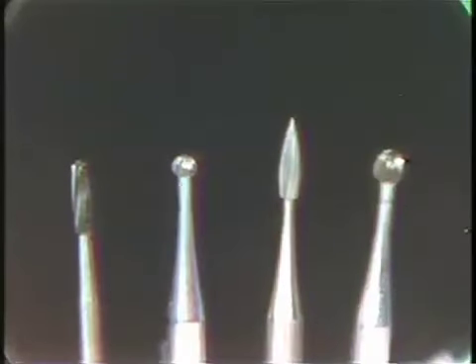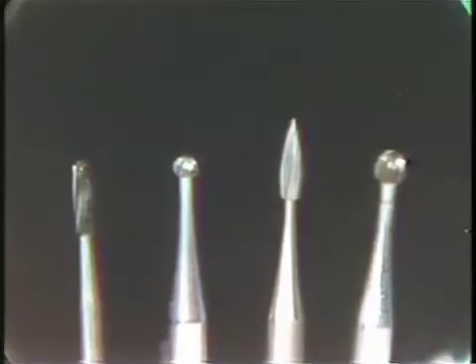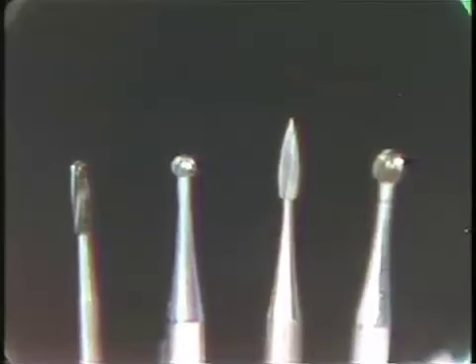So you'll take the straight handpiece flame-shaped burr, measure it about 8 millimeters longer than the regular length flame-shaped latched burr, cut it off with a Joe Dandy disc, and shape it to fit your contra-angle slow-speed handpiece, just as was mentioned in lecture.